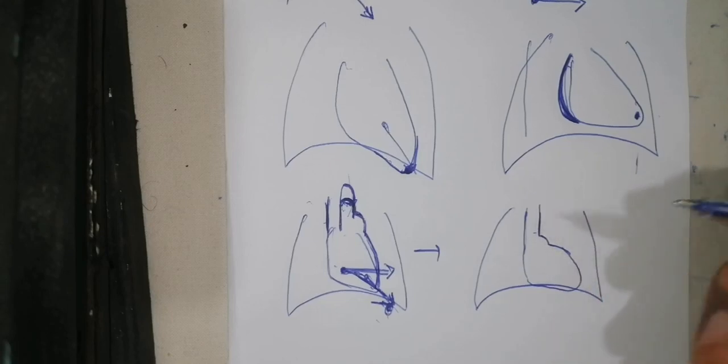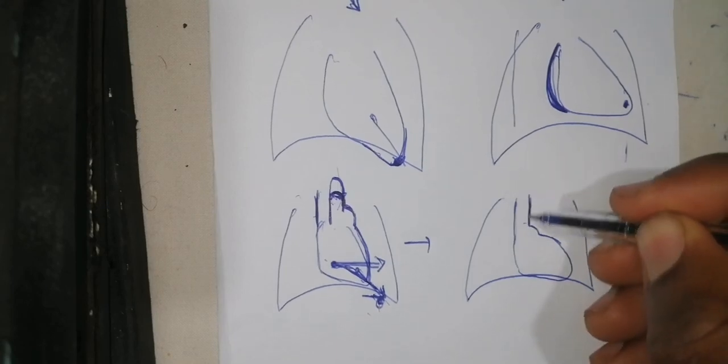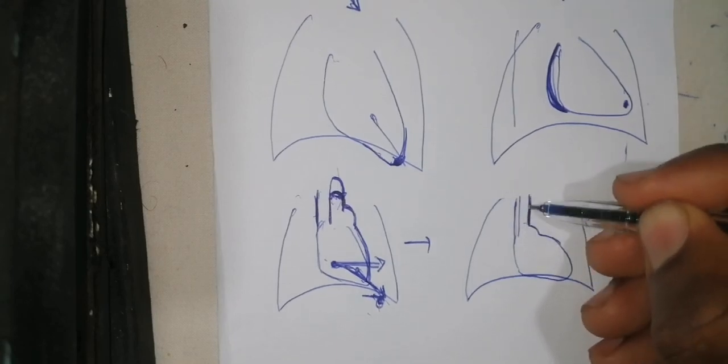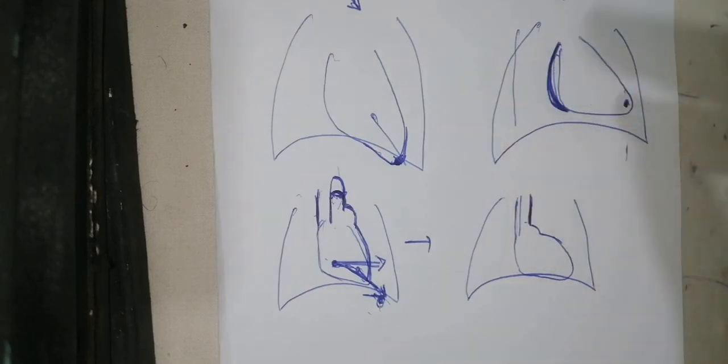If it's like this, you think of a systemic hypertension, an aortic hypertension. When there is a systemic hypertension, this arc here is going to get straighter. Is it clear? So showing you that there is hypertension inside the aortic arc, and that hypertension inside the aortic arc can also come as a result of an aortic stenosis. Is it clear? So those are the different elements that you have to understand.